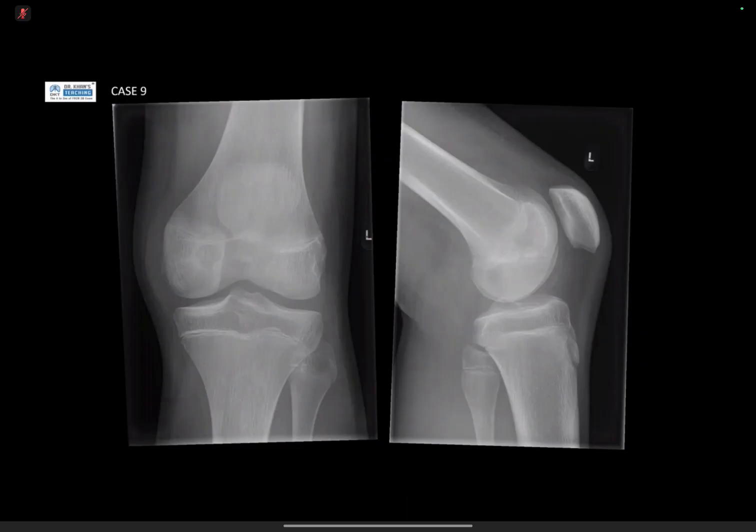The most worrying for me is in the medial condyle of the femur, there is a rounded lucent lesion with a thin sclerotic margin. It is well defined. I see some soft tissue swelling. However, I don't see any evidence of effusion in the joint space.